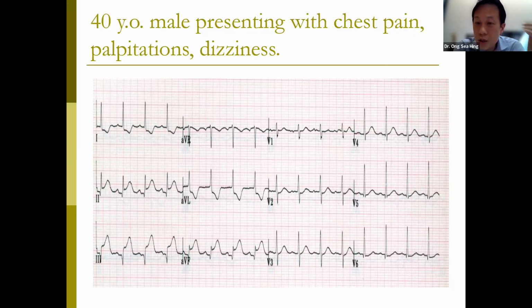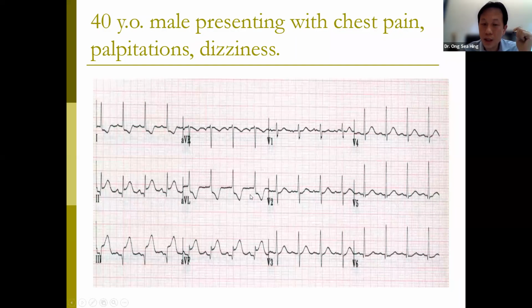Even when you see Q waves, like this patient, you have Q waves. Q waves do not mean that the infarction has completed. Q waves can happen quite early in the infarction. When there is no reciprocal change and when there is no more chest pain, then you know that the myocardial infarction is completed. Therefore, you don't have to rush the patient to the cath lab.